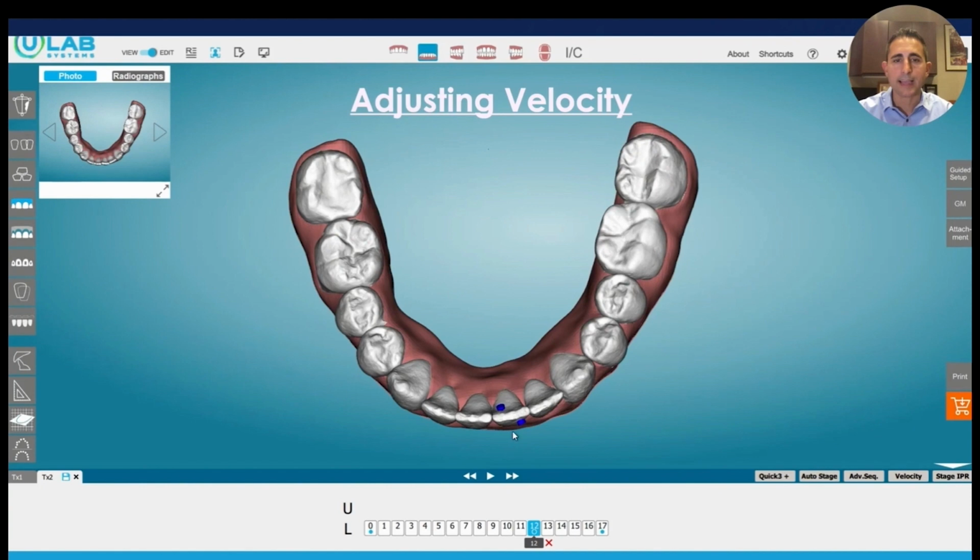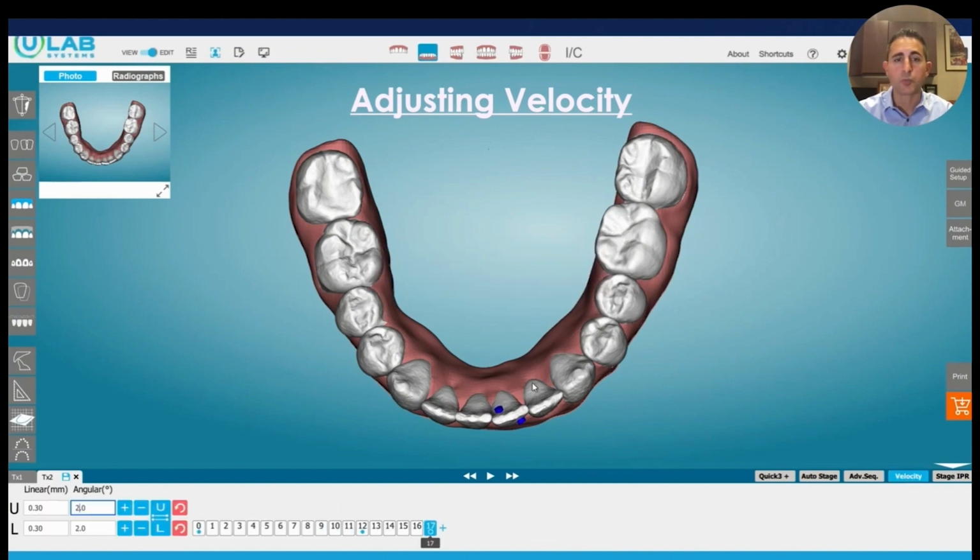So let's go ahead and look at that case again. We've already done our chairside refinement here, and you can see that the software, due to the default speed, has set this up with 5 additional aligners. If you were setting this up yourself, as a reset and cutting the tooth off the model and resetting it, you probably wouldn't reset it 5 times to make that small of a movement.